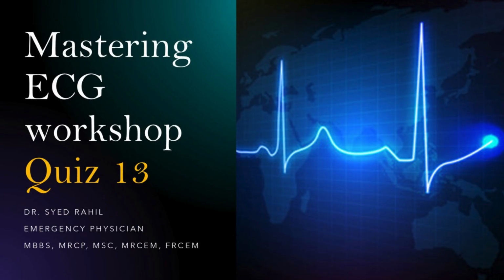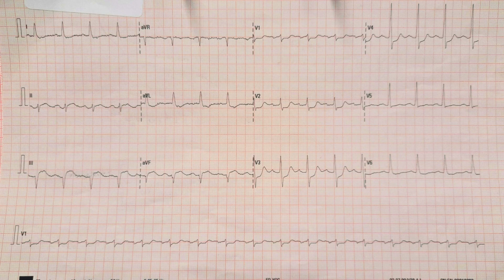Are you ready? Today's ECG belongs to a 68-year-old man who arrived at the emergency department complaining of severe central crushing chest pain. It has been ongoing for about 2 hours. Do you think you can accurately diagnose this ECG?